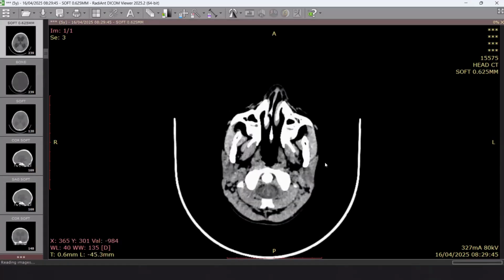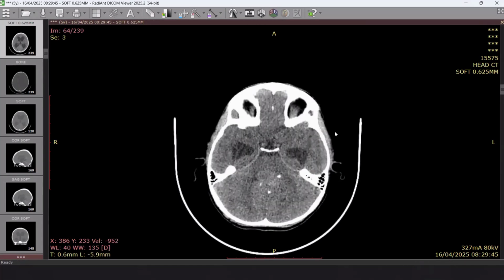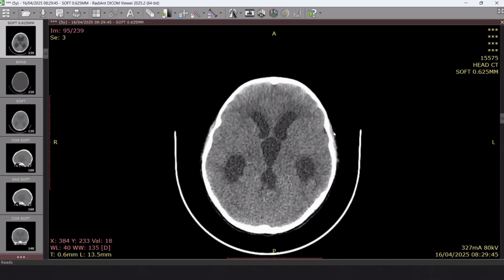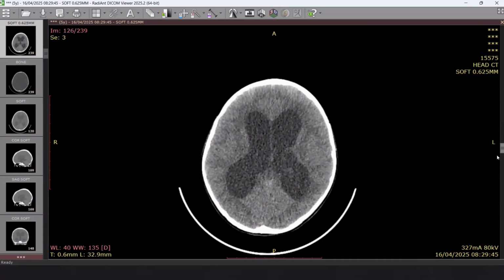What's your differential diagnosis in this case? I agree with you that contrast enhanced MRI study is recommended in this case. And also, after stabilization of the patient, we should do MRI of the spine to search for any CSF seeding or metastasis. Okay, give me a diagnosis and the differential diagnosis, please.